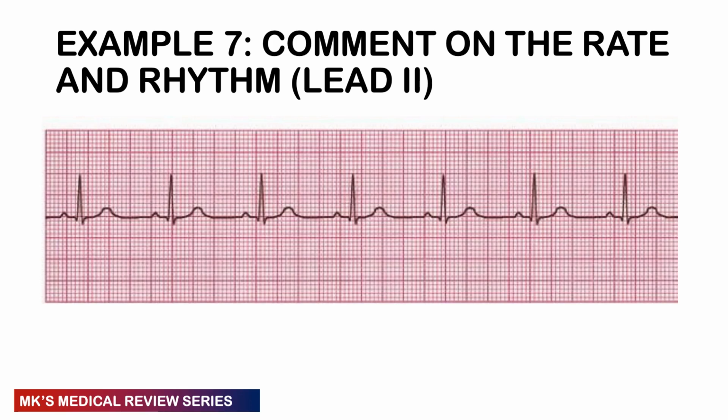So, how do you comment on the rate and the rhythm of this particular ECG displayed on your picture? You may pause the video at this particular moment.